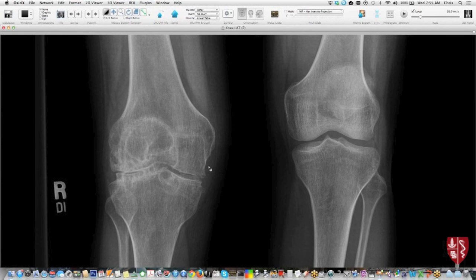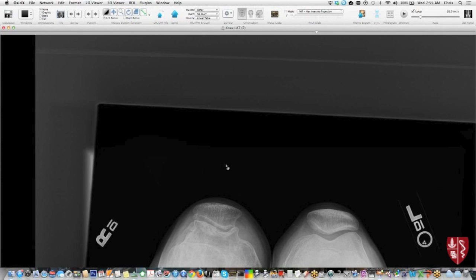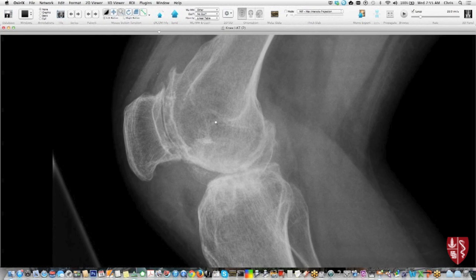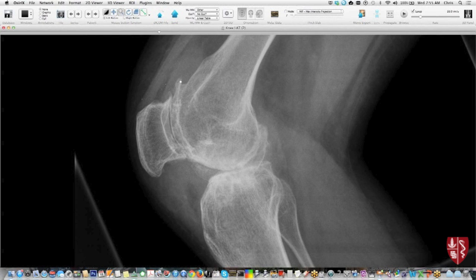In this example, the left knee is fairly normal, but the right knee has pretty severe arthropathy, like narrowing of the lateral tibiofemoral compartment, osteophytosis, and you can see on the sunrise view here, the lateral view, we can see that this is a female patient that she has fullness up in here consistent with a joint effusion or synovial thickening. And so a severe arthropathy in a 25-year-old should make you think of probably a couple of things.